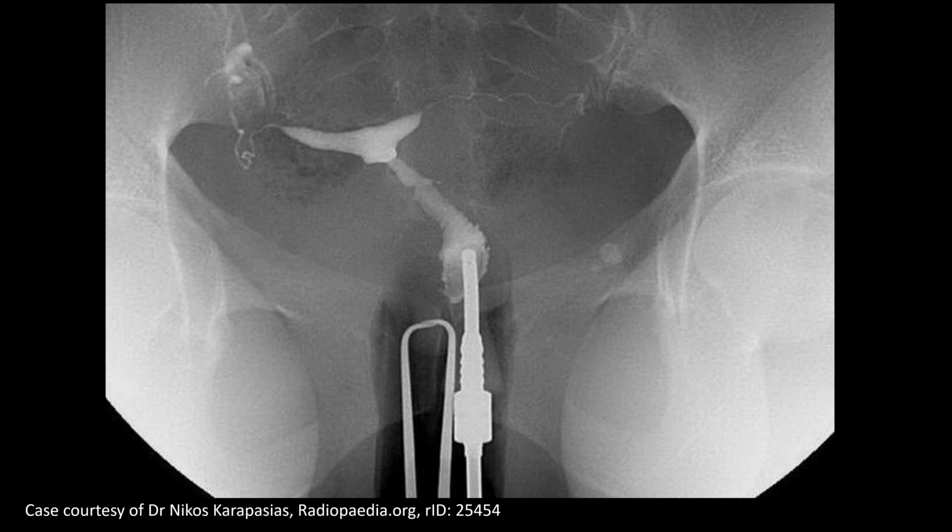We have enlarged the image. Here you can see the uterine cavity. This is the cervix as well as the vagina, and this is the fallopian tube. This white line is the fallopian tube. I am drawing over the white line. This is the fallopian tube, and this is the lateral end of the fallopian tube. Similarly, you can see on this side also.